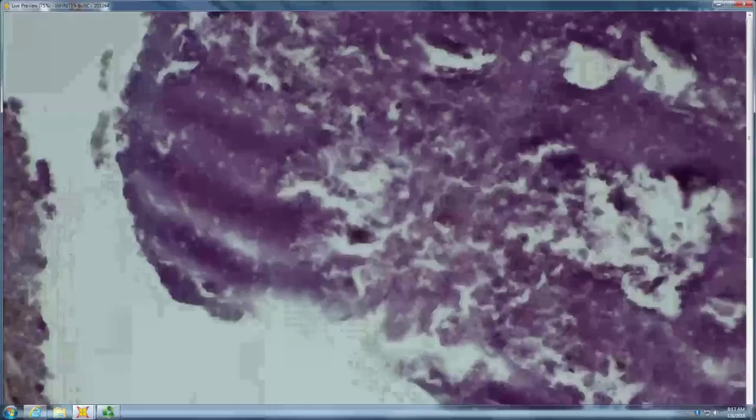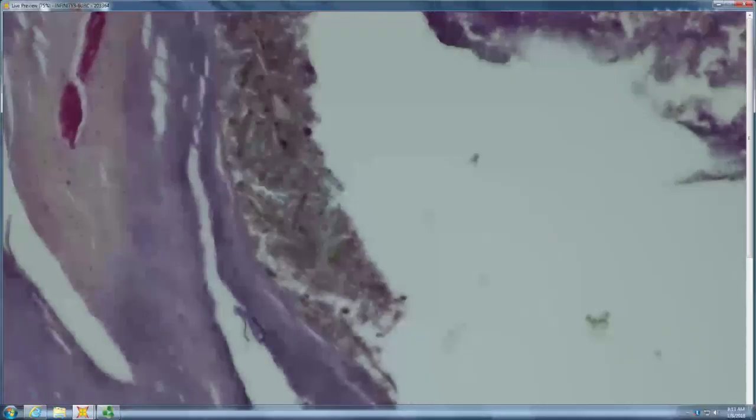Abscess and where there's transepidermal elimination, that's a good place to look for organisms. See, in there, we're starting to get them. So it looks like some yeast in there. So, again, not the right chapter, but right differential.